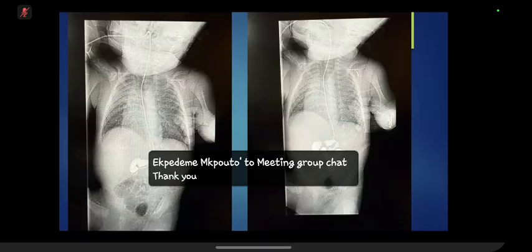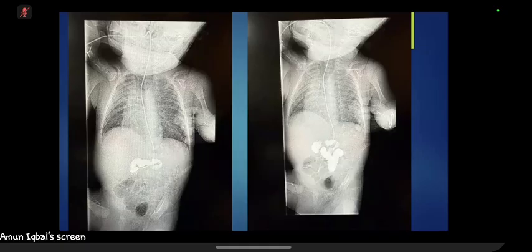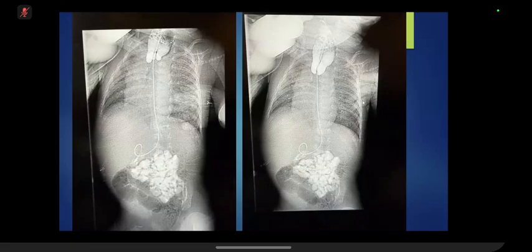This is a barium follow through, showing there is somewhat dilatation of the upper part of the esophagus. Barium swallow and follow through show dilatation of the upper part of the esophagus, but the contrast passes to the small bowel.